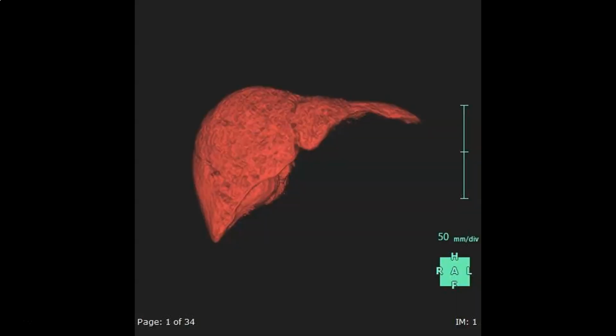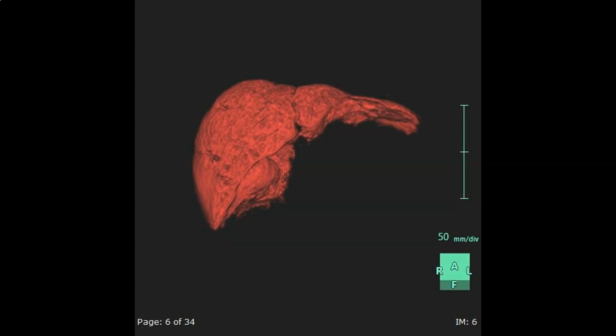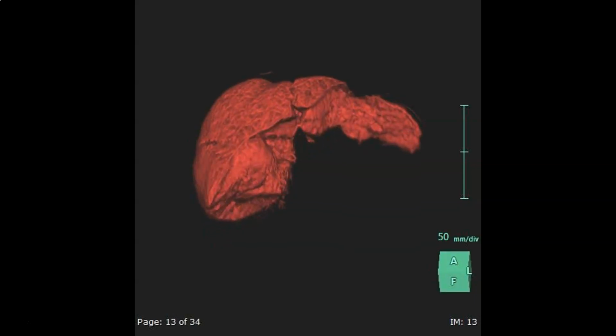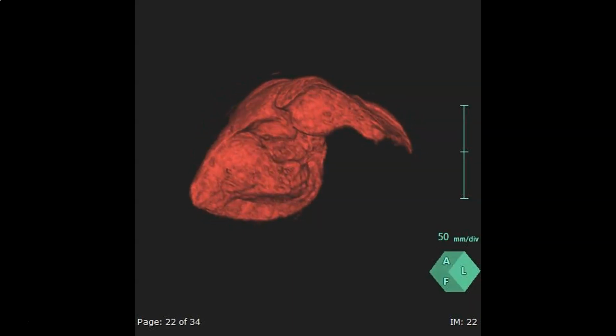This is a three-dimensional image of the fat-saturated T1 weighted MRI images of the liver, showing focal hypertrophy of the medial aspect of segments 5 and 6. In the normal liver, this part of the liver shows concavity due to renal impression.